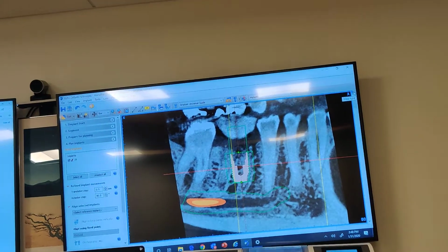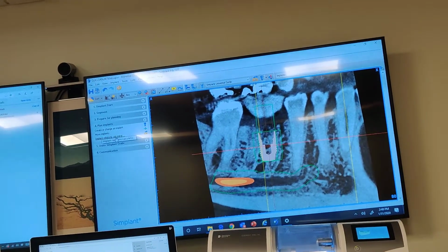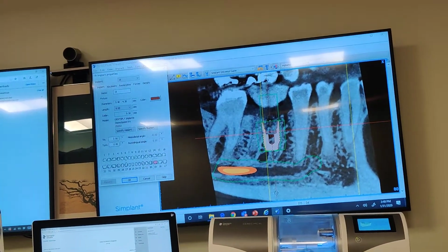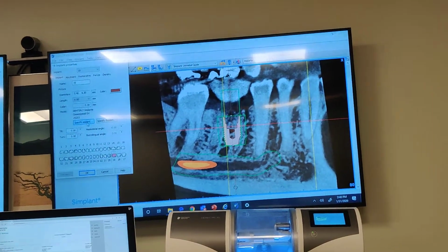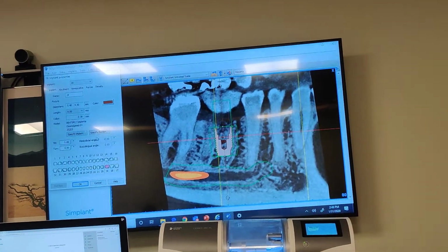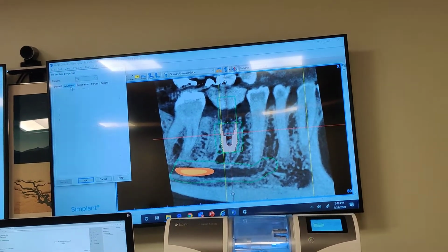Okay, that's great. Can you show us how to put a crown on top of that implant? Yes. So, we're in plan implants, and I double click the implant. Over here, if I was going to do a fixation screw, like if this is a bone guide and I was going to do the bone screws, this is where I do the fixation screw. Do you see up here? Look up here. We're just on implant, but look at abutment.